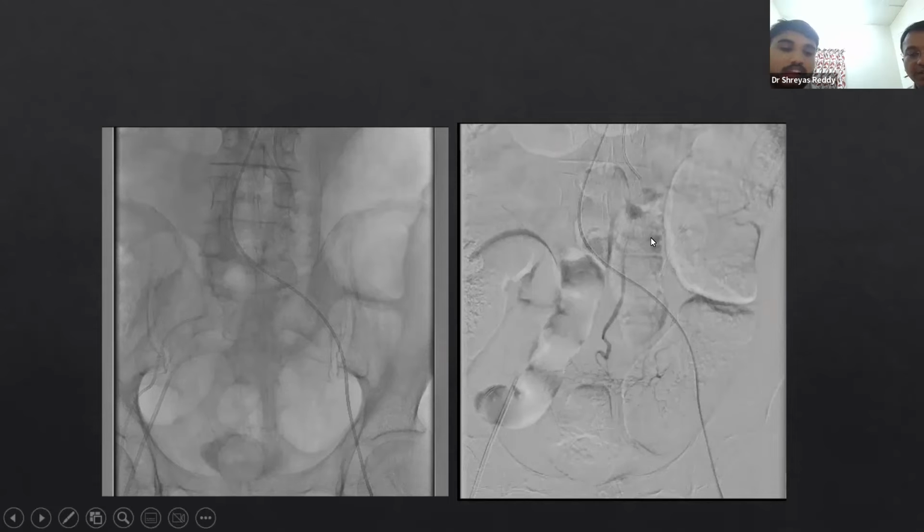What is wrong with that superior rectal artery? There is evidence of active flush. No, there's no active flush. Generally in gut bleeds, the artery goes into spasm after the bleed. The artery is tortuous and irregular, which is very common in a case of rectal malignancy. Even though we are not seeing a puddle or a flush, we'll still go and block the artery.